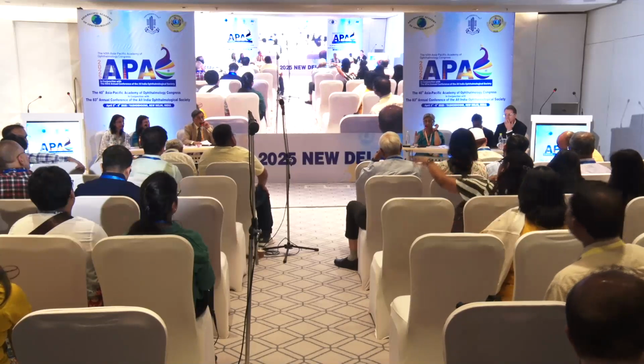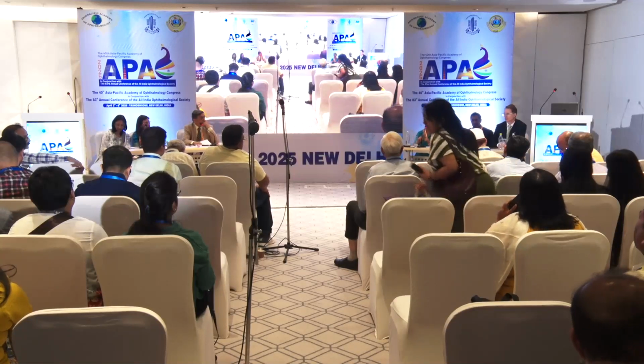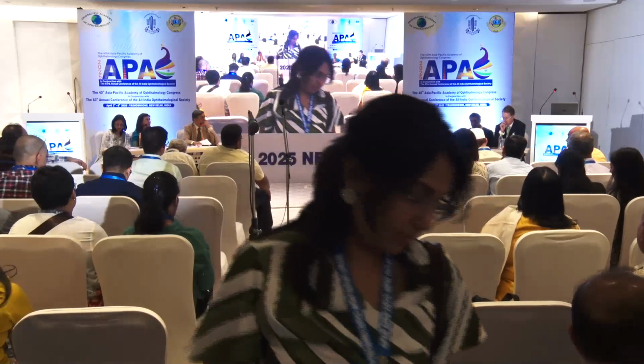What is very good is that now the two profiles are always matched to see whether there's any symmetry or not. We know that in glaucoma, if there is asymmetry between the profiles, we know that we're looking at something highly suspicious. So, we always look at this particular profile asymmetry, and if asymmetry is there, I would definitely like to investigate the patient for glaucoma. The last point which they have mentioned is about hypermetropia.